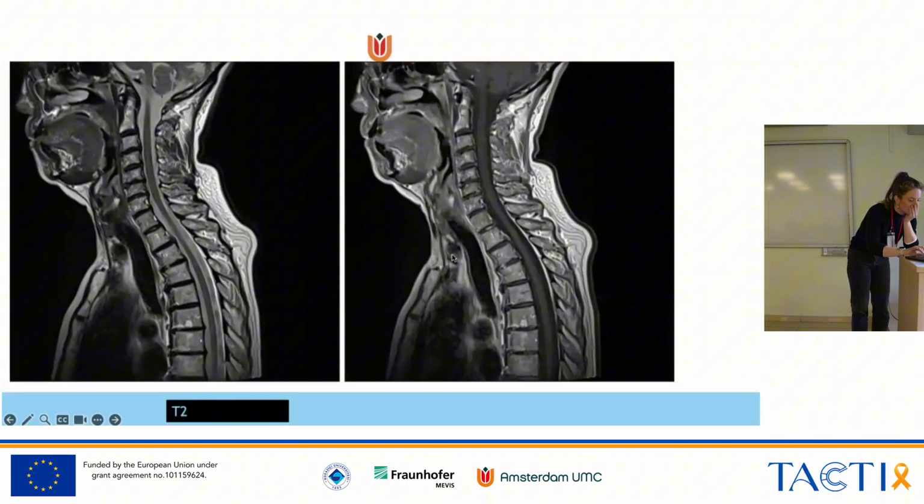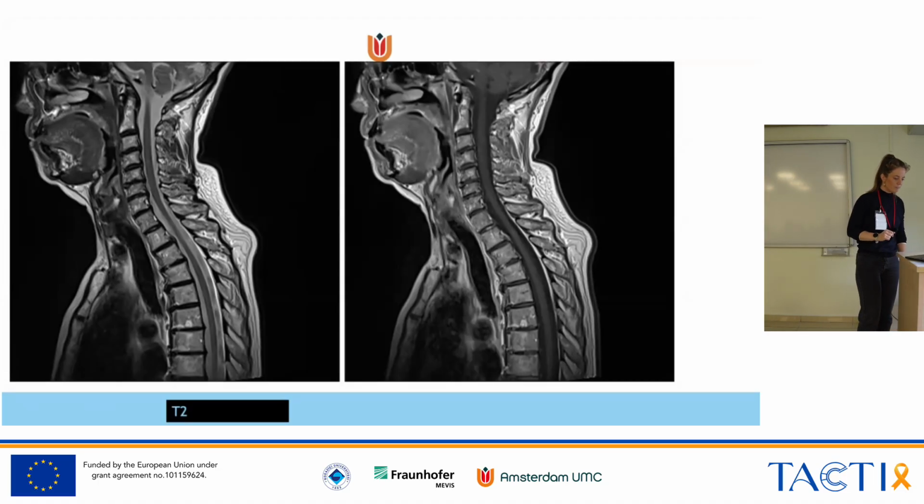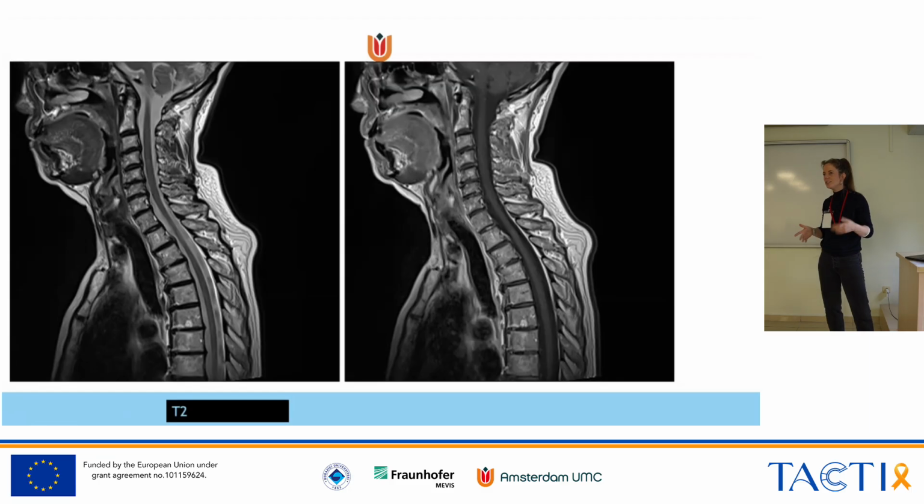and I'm not sure if you can see it on the screen here. It's very subtle. No, I think you can see it. There was this little bit of contrast enhancement in the lesion. So it was clinical PIRA, but with active inflammation. So it wasn't the full neurodegenerative PIRA. And I think it's a thing that you would call PIRA with MRI activity at the moment.